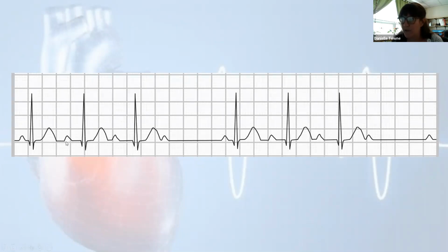All right, let's look at my next one. Well, that one looks longer. The third one looks even longer. And now I have a P wave with a dropped QRS. Then the PR interval looks normal again. This one looks a little bit longer. This one longer again. P wave with a dropped QRS. QRS complex, nice and narrow. So I know that's not coming from the ventricles.